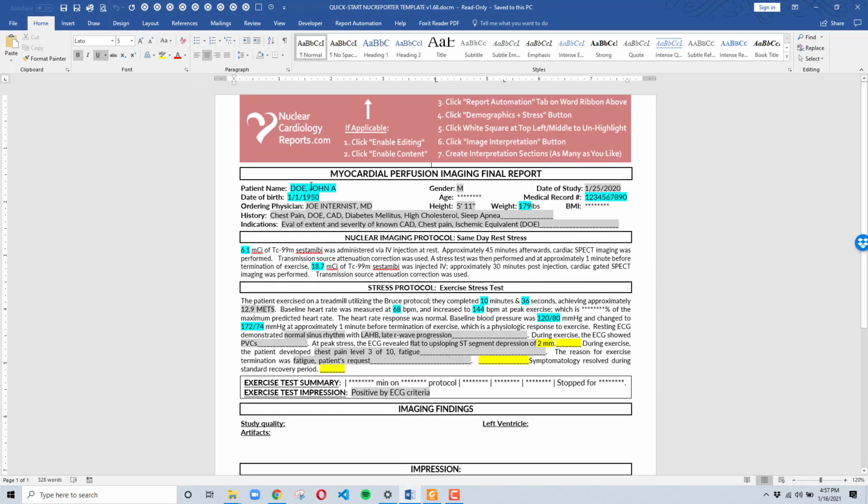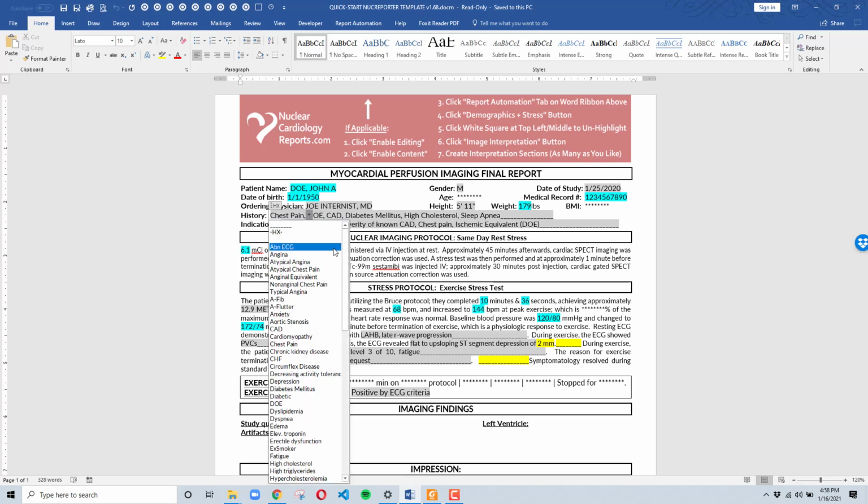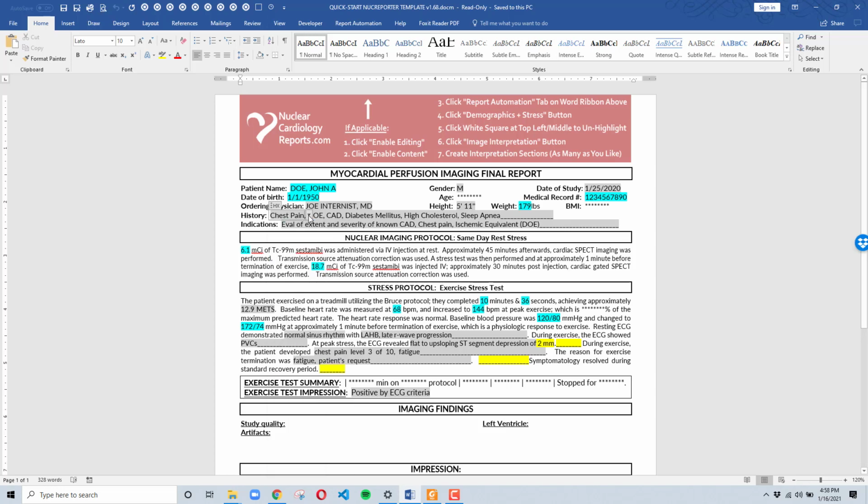Well, not a blank template, but one that's already been filled in. Essentially, everything in blue is typed in. Everything in gray are IAC required report elements, and they're all dropdowns with all the choices in there. Anything that's in yellow is not IAC required, but is sometimes appropriate.